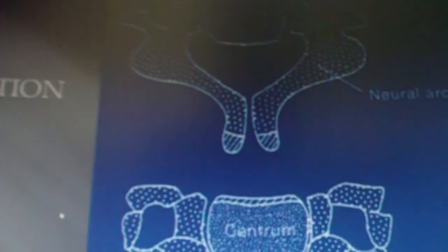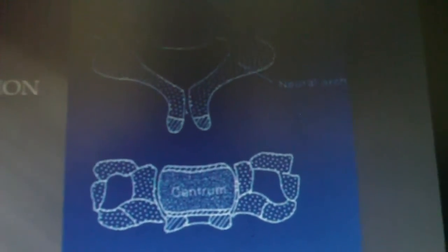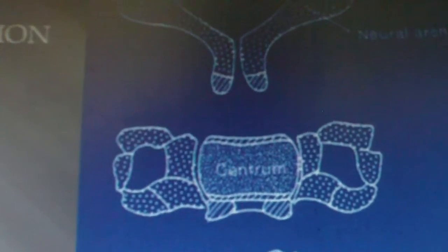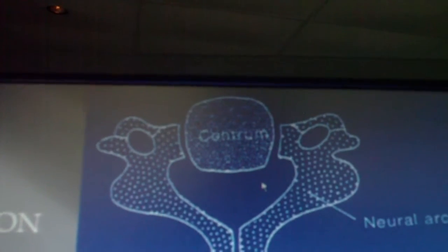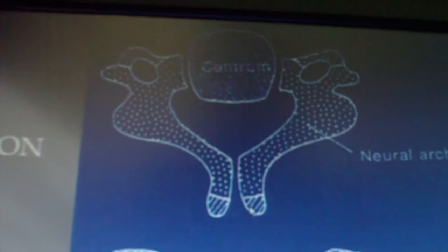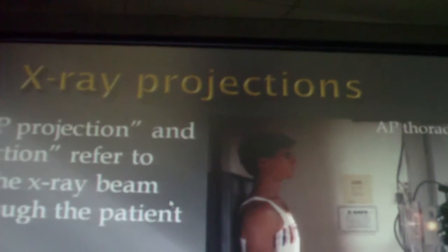Okay, so again, now we're into typical vertebrae. Again, there could be some issues here. I don't know that with a typical vertebra do I ever see at the pedicle, and that's what these areas are here, that there is a detachment. It can occur though. Okay, and spina bifida though you see with frequency.